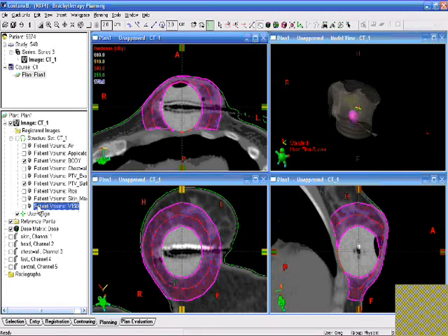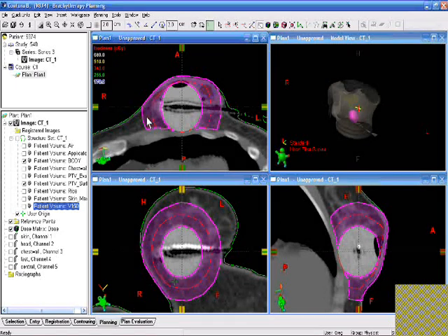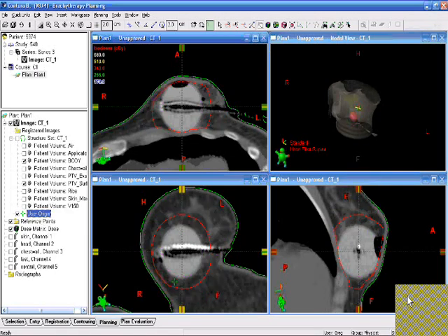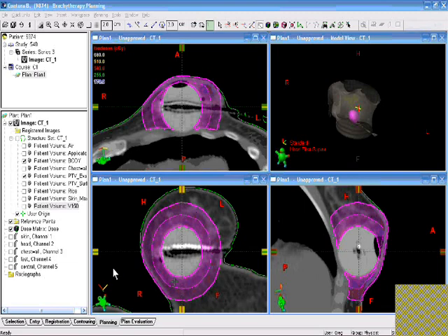If we look at the V150 volume instead, you can see that I've included all of this, and I've been fairly generous out here as well. Remember also that we don't include the chest wall in that, because the purpose for the V150 and the V200 is to avoid fat necrosis, which really is the only tissue that's implicated in that is the breast tissue itself. So just another item to keep in mind.